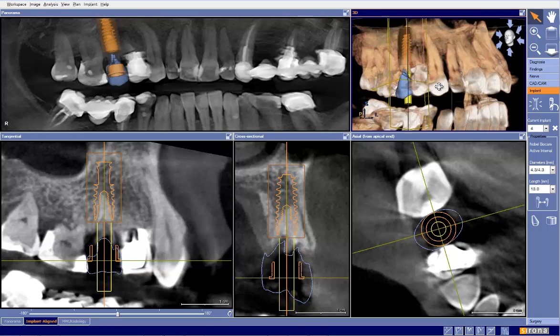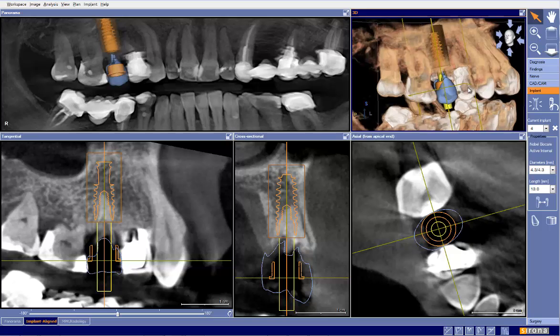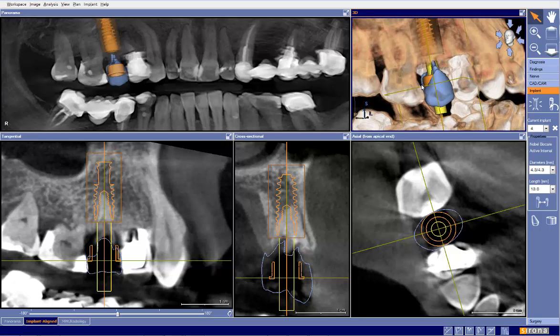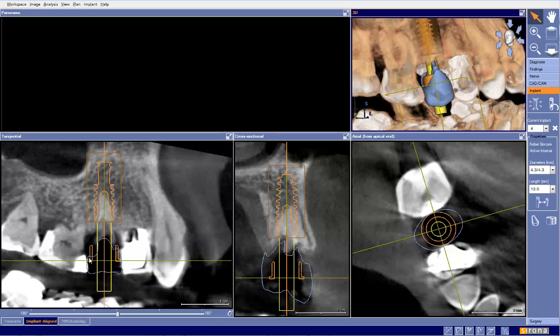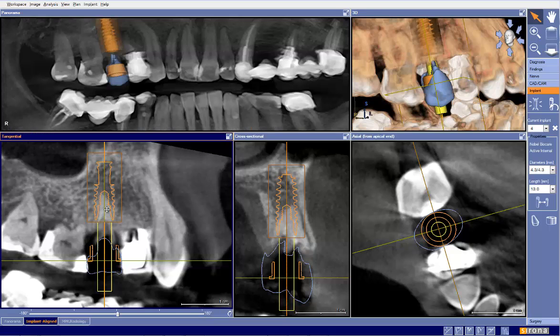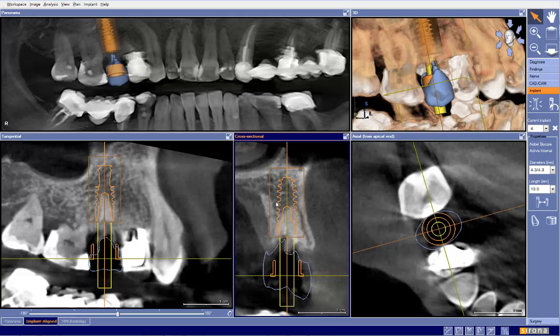My guess is this tooth may have fell out some time back, and we can see here actually in the axial view how that tooth is probably a little over contoured with that restoration. So I would go ahead and probably err, to be honest with you, err on the side of getting it from the mesial of tooth number 3. So buccolingually, we're pretty well centered.